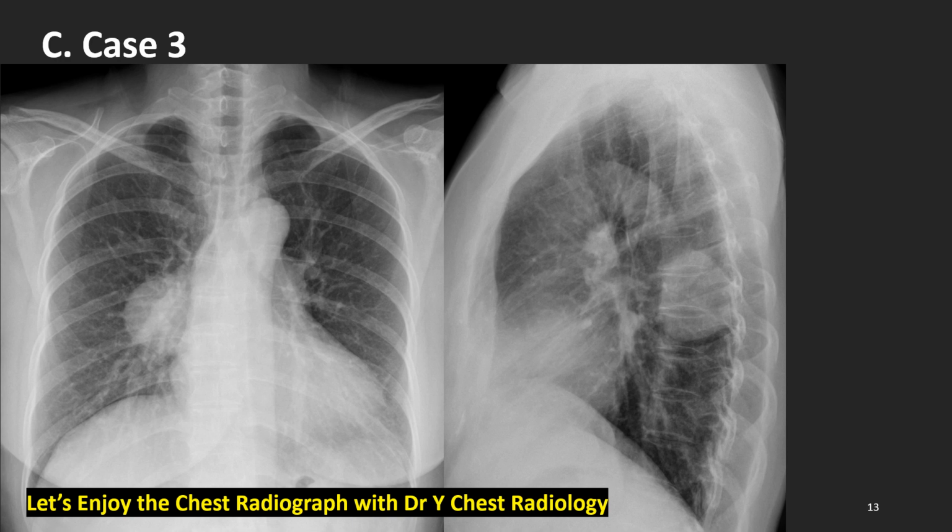Case number 3 with this middle-aged woman. What do we see? A well-defined round lung mass, or a well-defined half-moon-shaped broad-based mediastinal mass? Let's look further.